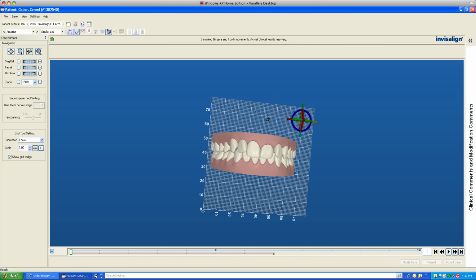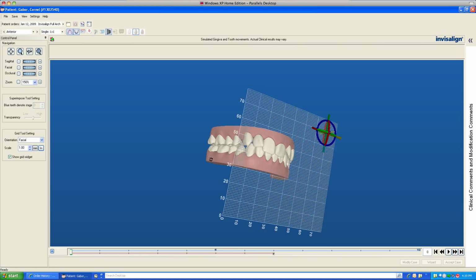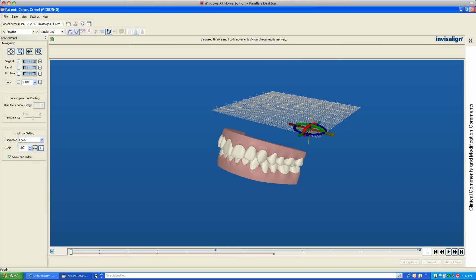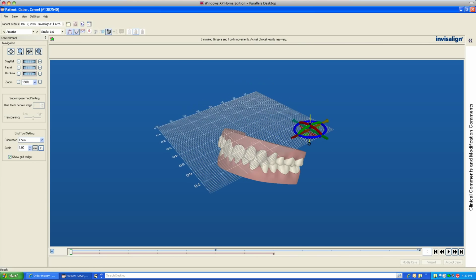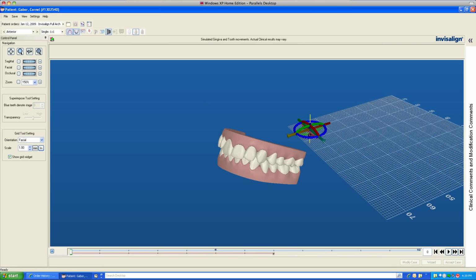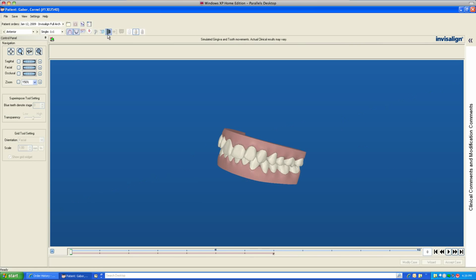The grid is, again, something to measure movement. Very, very cumbersome to use. So you have your different axes here, which you can rotate the grid. But as you can maybe see, it's a little bit finicky, and it's quite difficult to place spatially. And as for its accuracy as well, we'll do some tests when we talk about the movement, but as for now, we'll just leave it alone.